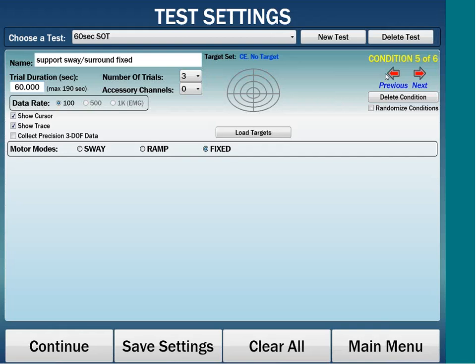That is just the general overview of the static. The testing screens are just the same. If you have multiple conditions, you can randomize them, and that is all that I will cover on the static. Now, the data that you have collected is accessible via an export, the NeuroCom system data export. I will navigate to present the export options.